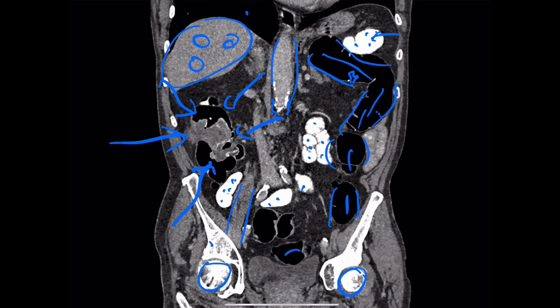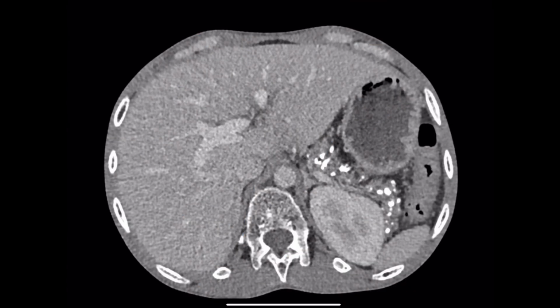Yeah, thank you, Colin. Okay, Colin, we're back to talk about another axial CT image in one of my patients in the past who presented with gross weight loss and some rather pale, bulky, offensive diarrhea. And as usual, part of our diagnostic workup included a CT scan. And as usual, you come up with the goods. So point me out a few structures and take me through this, Colin.